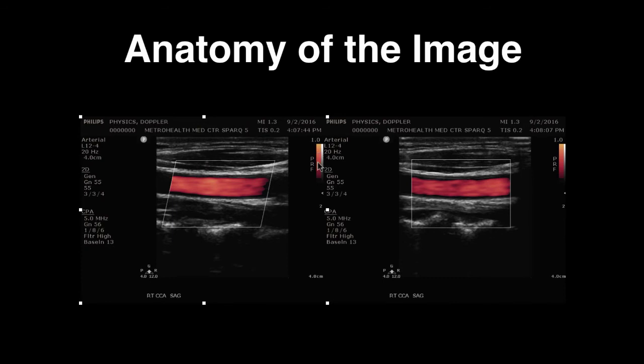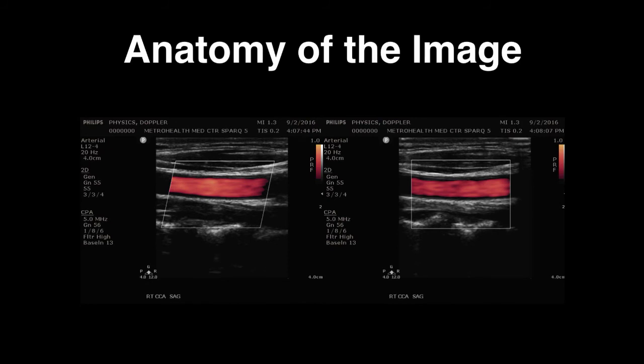Now remember, when you look at the color map here, it's not giving you directional information like the color flow image gave you the velocity map. Here, this is amplitude driven with the weakest to the strongest signals being displayed, and you can see how that's mapped out, using the color map here. But again, it's not giving me any information about direction. Lastly, just as in color flow Doppler, you have the ability to adjust transducer frequency, Doppler gain, and wall filter setting.